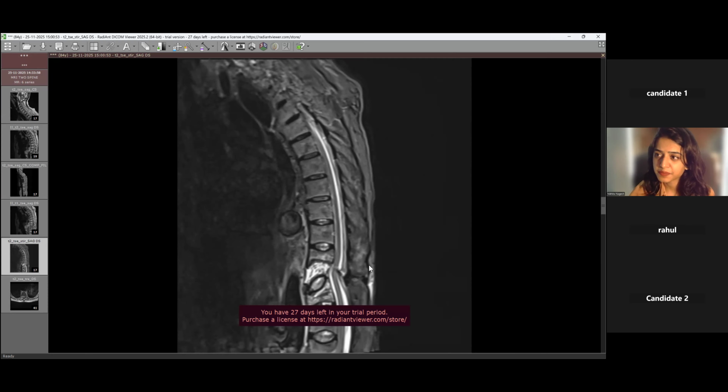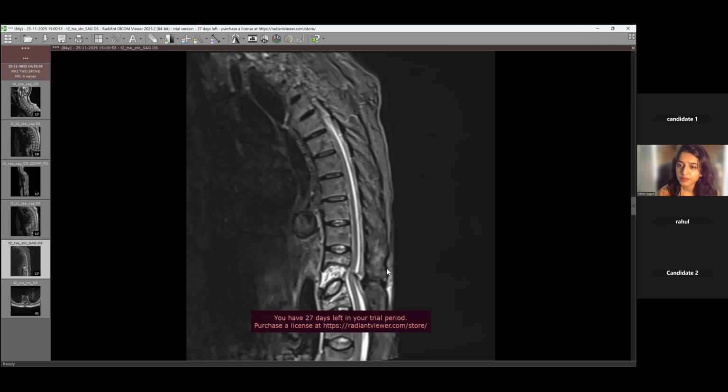Yeah. So as I was saying, the first thing is to ask whether the patient had any trauma, even a trivial trauma, because if it's this case of what looks like a DISH, even a trivial trauma could mean that it can have a transverse fracture across both anterior and posterior elements and cause this abnormality.